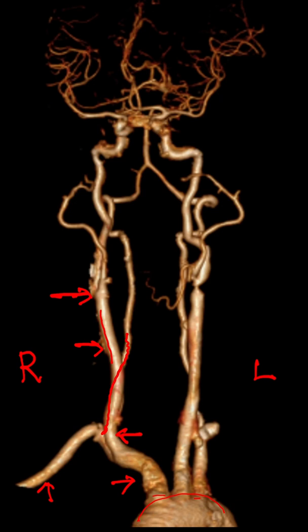And here, which level is this approximately? Lower border of C4 vertebra. So on a radiograph, you can identify the bifurcation approximately corresponding to the lower border of C4 vertebral body. Here it divides into two branches: the internal carotid and the external carotid. Now you trace the internal carotid artery. Now here, when you reach here, you might get confused about which vessel is which. So stick to what you know: this is the internal carotid artery, this is the petrous area. So you trace this vessel down, you know that this is the internal carotid artery.